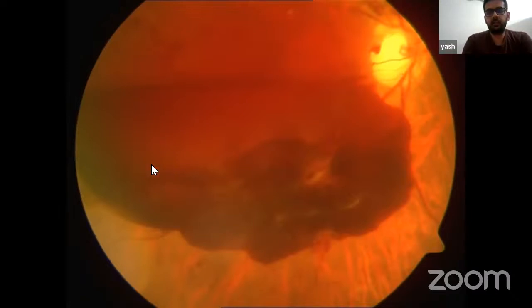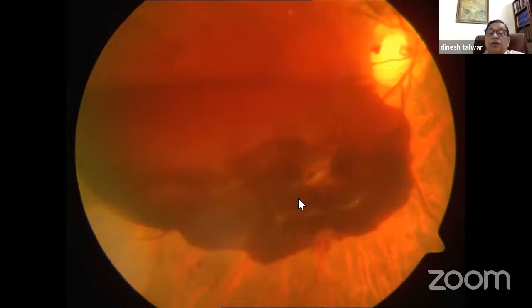Sir, the doubt that I have regarding this patient is, is it pre-retinal with some subretinal hemorrhage? Because at areas like this, it's looking like a fresh bleed. Yeah. And the color of the blood is altered, because it's more blood, it's thicker blood, and part of it may be clotted.